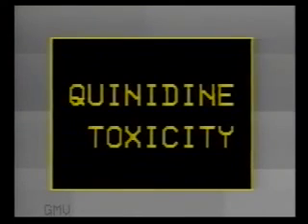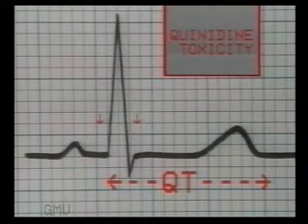Quinidine toxicity. Quinidine toxicity results in lengthening of the QT interval and also widening of the QRS complex. Note that in this ECG, the QRS complex is widened uniformly and the ST segment is also prolonged with overall lengthening of the QT interval.